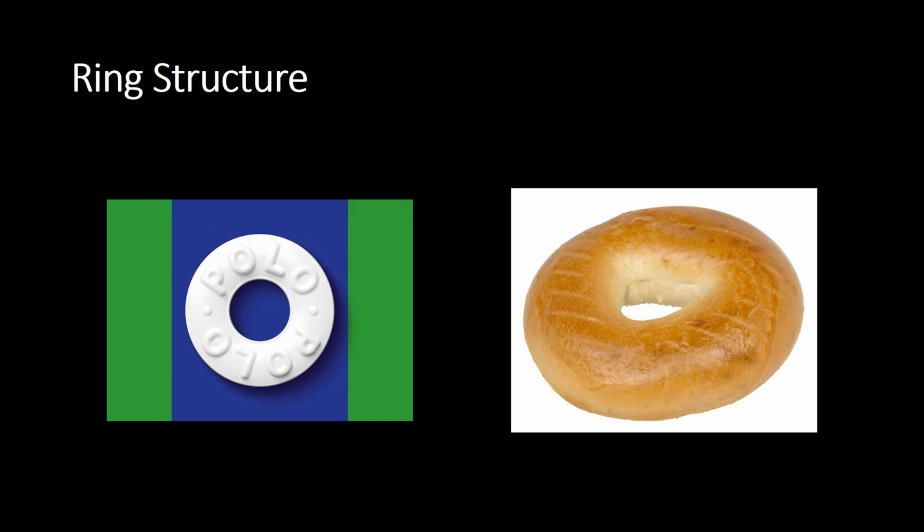And so a better analogy is maybe of a bagel. It's perfectly possible to tear a bagel and not break it on the contre-coup border. However, you will get crinkling of the bagel surface. And so this is a good example of where you can get a fracture to the bone, but then you'll get ligamentous disruption in another location. And so that's a much better kind of analogy. However, we should always be careful and make sure that there is only one fracture and there are no other fracture fragments detected.